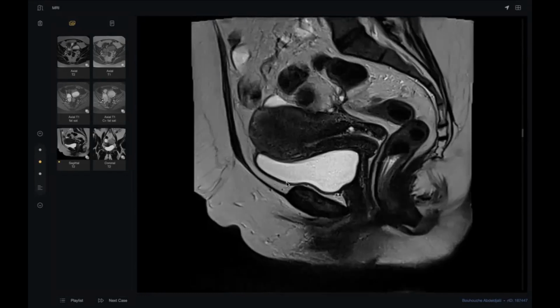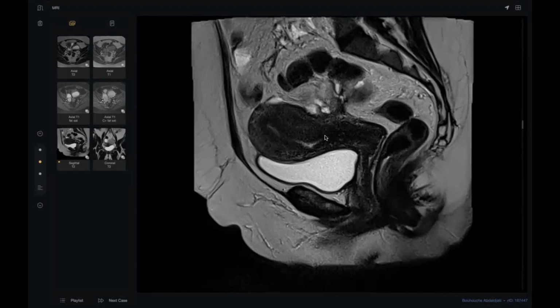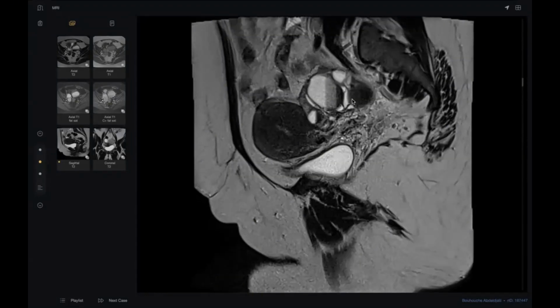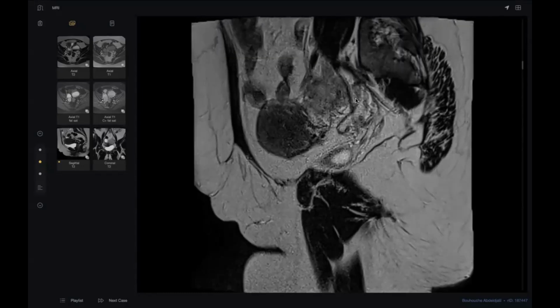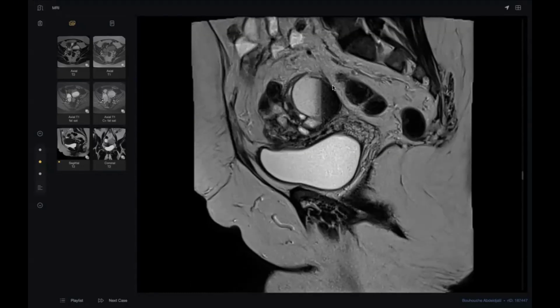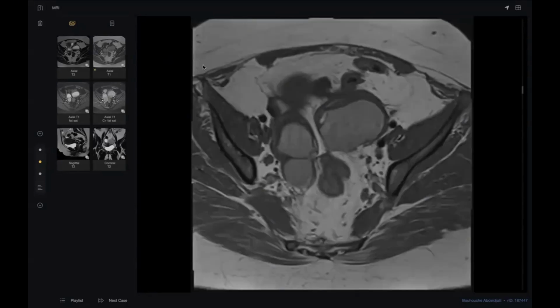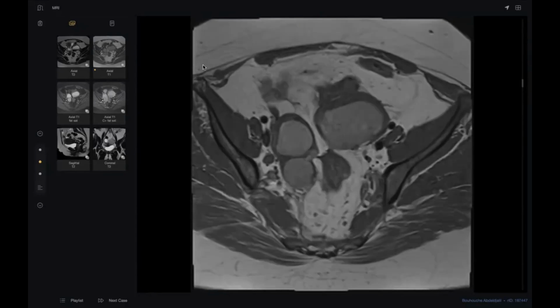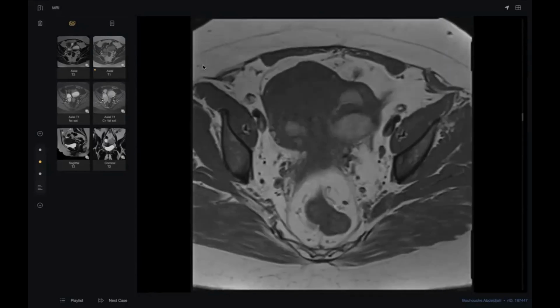This is a case of adenomyosis here, posterior. Second point, see my colleague here, the fluid levels of these ovarian cysts. What happened here? This low level dark signal is hemosiderin. This is very important. This denotes a chronic hemorrhage. Here also, this is T1 bright, almost a bright signal.